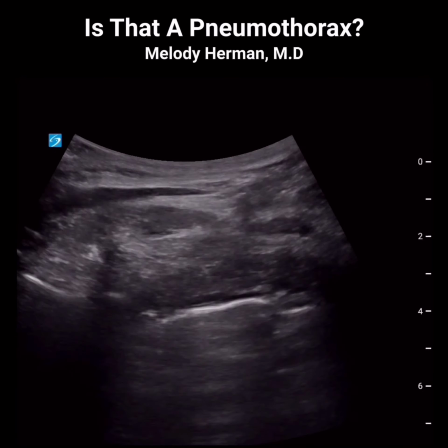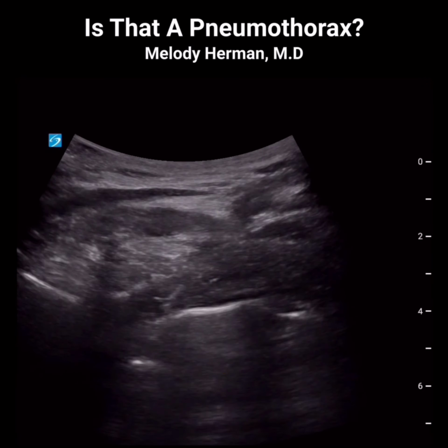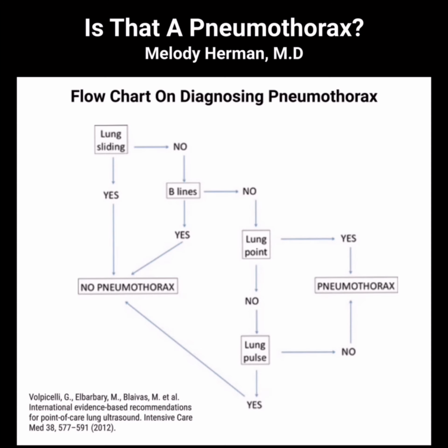Have you ever done a chest wall block and noticed that the lung looks abnormal on ultrasound? Could it be a pneumothorax? In this video, we'll cover the flowchart on diagnosing pneumothorax from the International Evidence-Based Recommendations for Point-of-Care Lung Ultrasound.